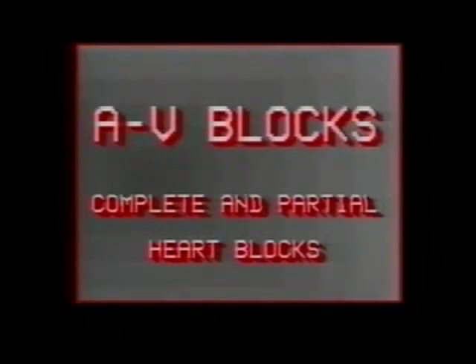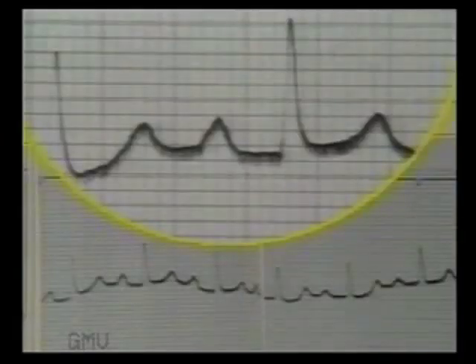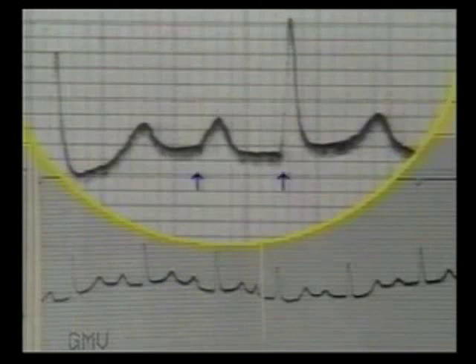AV block: complete and partial heart blocks. First degree AV block, or first degree partial heart block, is a block in the AV node. In this ECG, measure the PR interval. It is 6 small squares, or 0.24 seconds. The normal range for the PR interval is 3 to 5 small squares. So this ECG shows a prolonged PR interval, indicating delayed conduction from atria to ventricles.